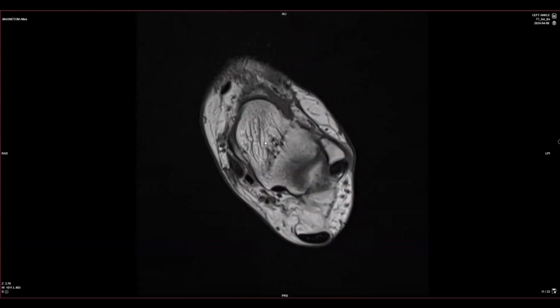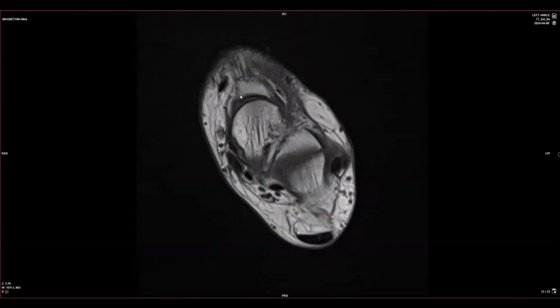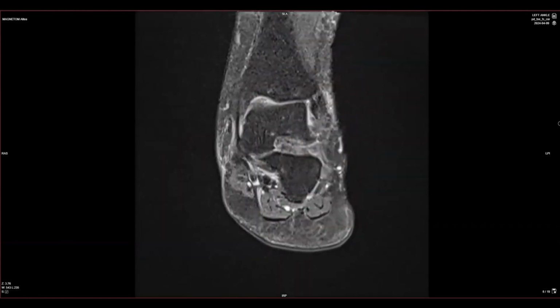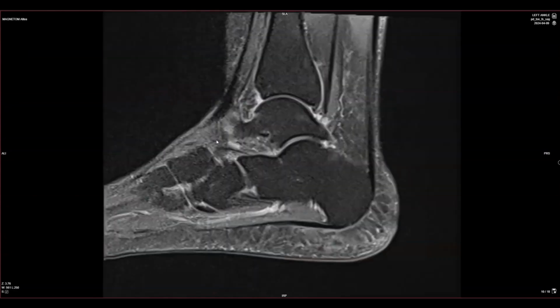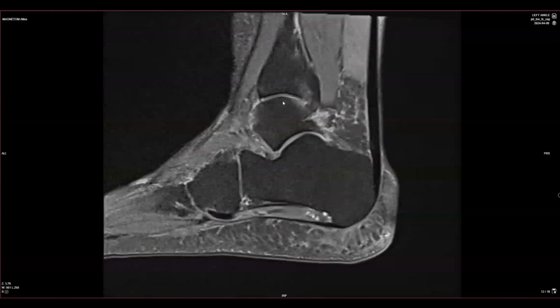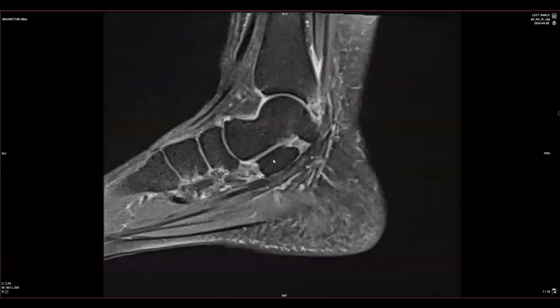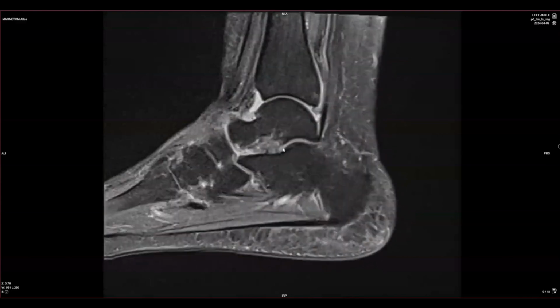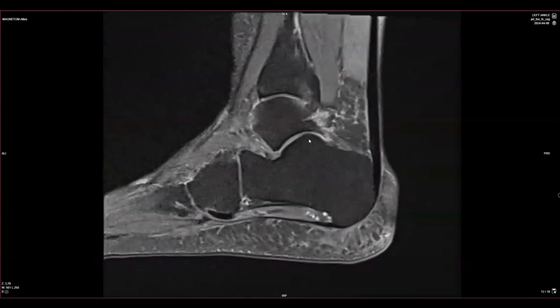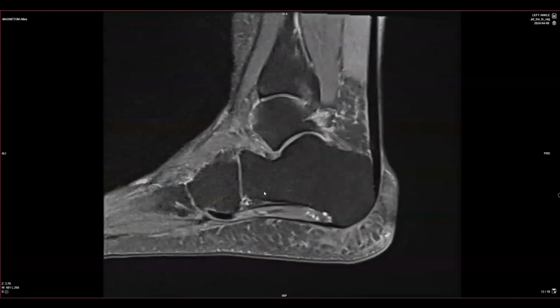These trabecular lines of stress are what the body has to do to get this person to have a biomechanical forward motion. Looking at the posterior talar dome, which I can't see very well on this, so I'm going to go to my sagittal and see what we're missing. Probably just a little bit of edema, tibiotalar mild edema, and what I have is a relatively normal arched foot. There are some dysplastic features to the talus. There is some curvature to the articulations. None of them are severely degenerative. I would not have called a coalition in this case.